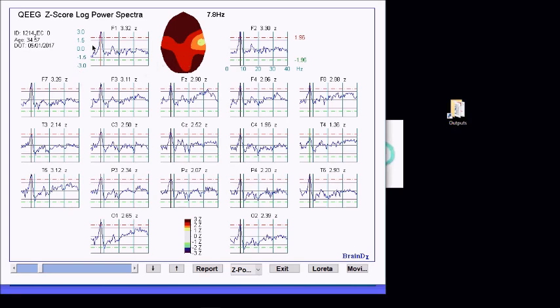And then the outliers, when we open the software, it opens directly to that greatest outlier, which is found to be in red at FP1. We know our range over here. So, always looking for those headers. You can see that in general this is an overactive spot, and in what would otherwise be apparently a more normal type of brain pattern.